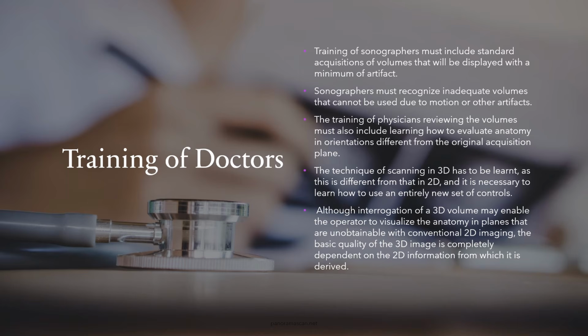Although 3D and 4D imaging techniques allow for visualization of anatomy in planes that are not obtainable with conventional 2D imaging, the basic quality of the 3D image is still entirely dependent on the quality of the 2D information from which it is derived. Proper 2D scanning techniques and high-quality base images are essential to achieving accurate and reliable 3D reconstructions.